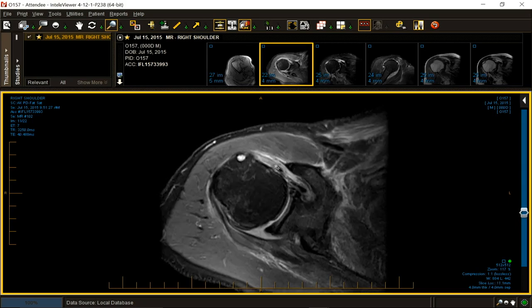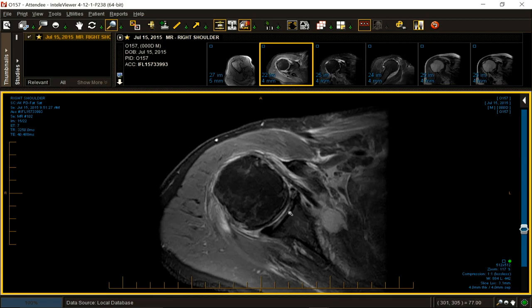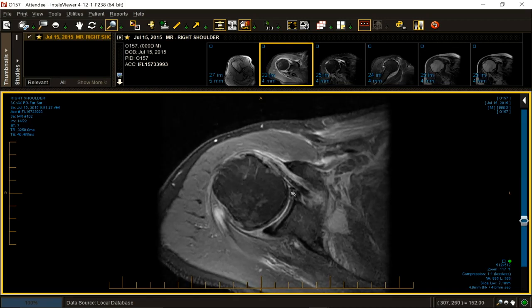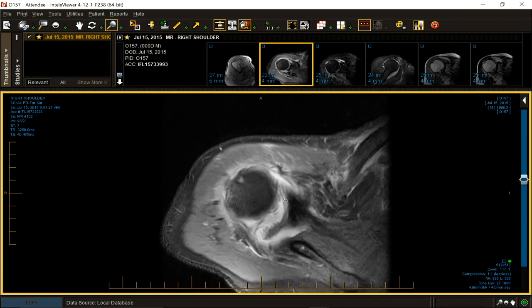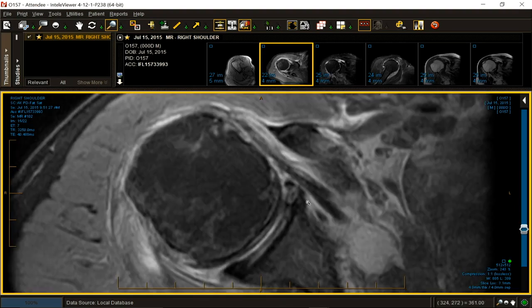What about the conformity and configuration of the cup and labrum? Not bad considering the severity of injury. How about the labra? Chronic, mixed signal intensity anteriorly, no signs of a dislocation, no signs of a Hill-Sachs, chronic degenerative tears of a middle-aged to elderly woman.